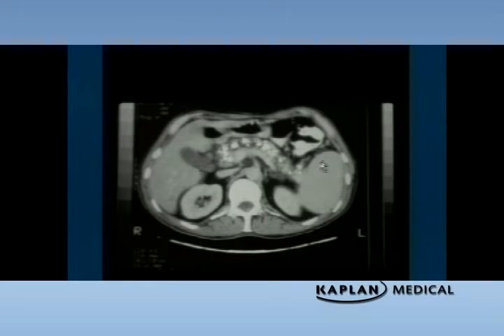This is a CAT scan of the same type of patient. Here's the gallbladder, here's the liver, here's a kidney, and here's another kidney. You'll notice the kidneys are not at the same size because on the right side, the liver shoves the kidney down lower into the abdominal contents. Whereas on the left side, there's no liver above it, so the kidney rises up. So this is the bottom of the left kidney and the middle of the right kidney, because this one is lower because the liver shoves it down. This is a gallbladder. This is a spleen.